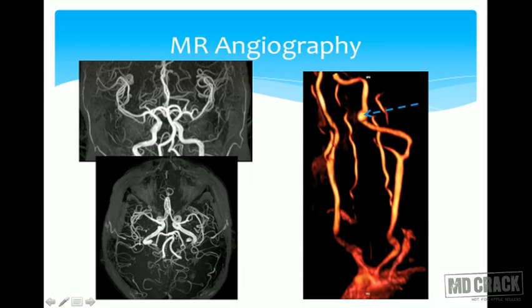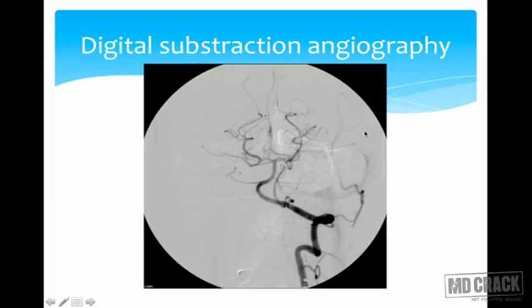This is your basilar artery, your ICA, your MCA, and these are anterior cerebral arteries. This was one patient where, when we performed the MR angiography through the neck vessels, we saw a small aneurysm through here, but it was a non-thrombosed aneurysm. So it shows us that it's a fusiform aneurysm.